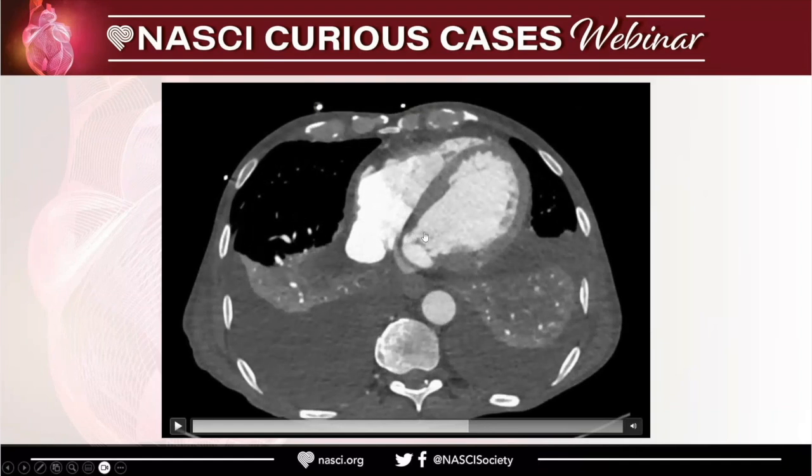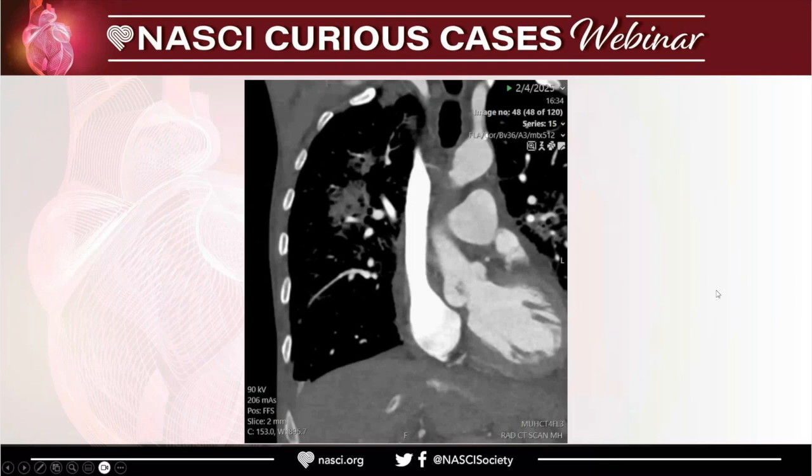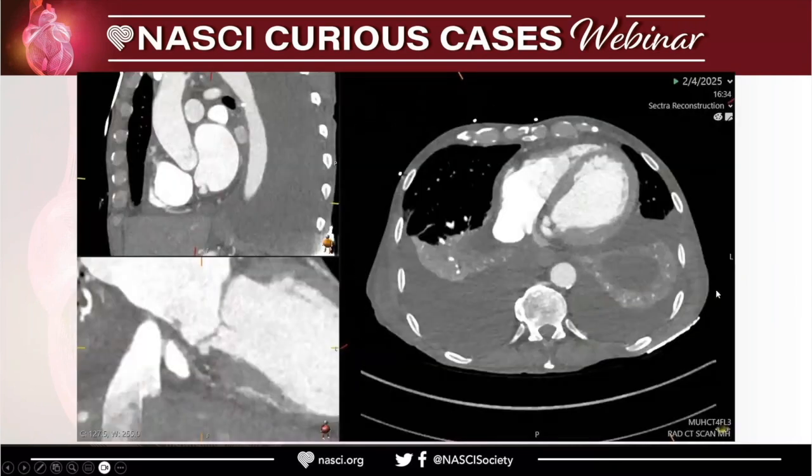You should not lose that. What you will see is that the muscular part will be away from the annulus, and this part is outpouching. This is not like that. This muscular part is coming to the annulus. So if you have a gap between the annulus and the muscular part, then we think about mitral annular disjunction. Sorry. Okay, so if you guys agree, then I did correctly report it.